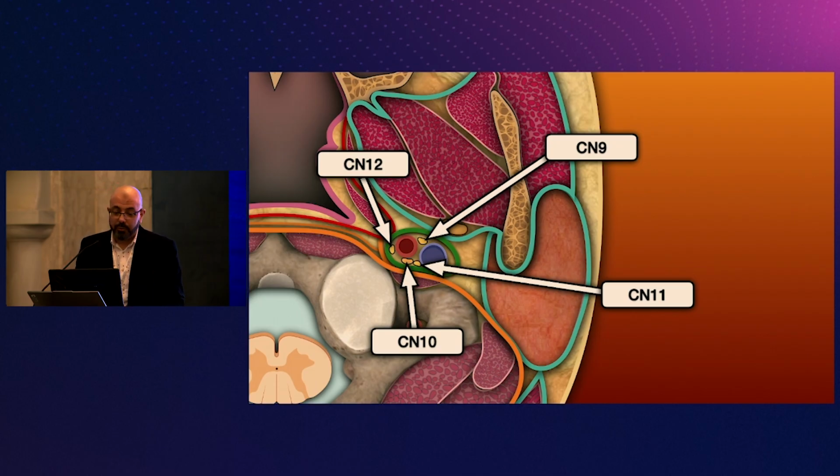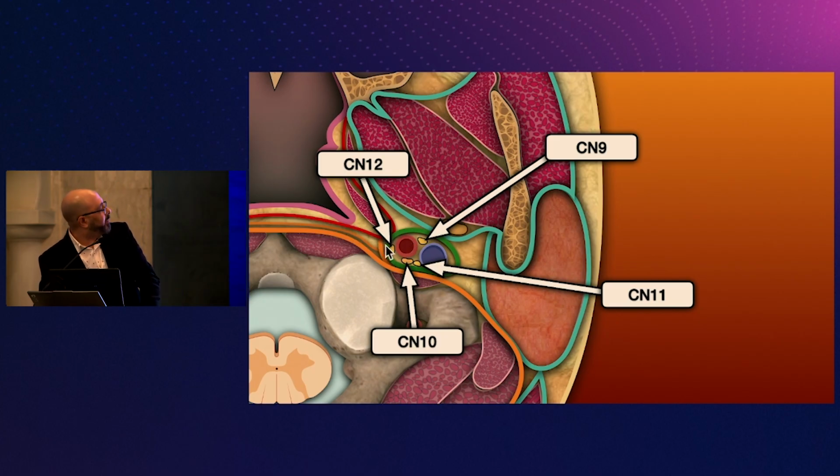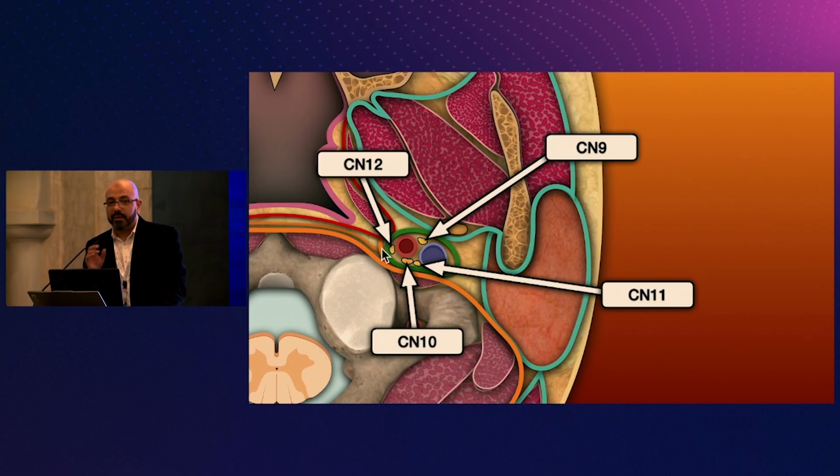It's very important to know that we have a very important neighbor next to us, which is the retropharyngeal space. Sometimes you can get metastatic RP nodes, retropharyngeal nodes. In some patients, the medial fascia of the space is deficient, which means that if this RP node starts causing problems, the closest nerve to it will be number 12. We'll show you a few examples here.